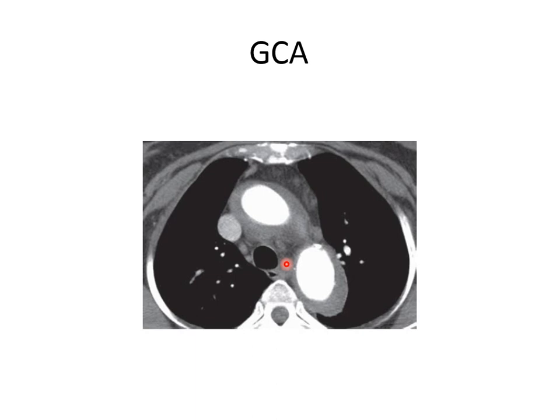The most important thing is the location of the affection. Giant cell arteritis mostly affects the ascending aorta, whereas Takayasu mostly affects the abdominal aorta, then the descending aorta. Here, giant cell arteritis mostly affects the ascending aorta and extends to the arch, and could cause affection to the descending.